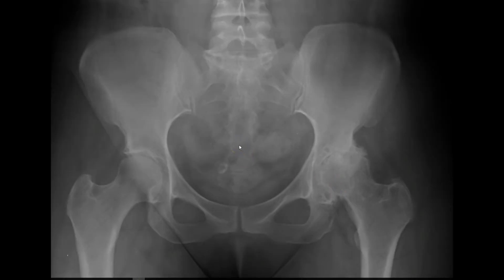So again, just a close up view. She also has a calcified myoma. She's got some fecal material ready to exit. SI joints look like they're holding up pretty well. Symphysis pubis definitely holding up very well. And we were able to get every bit of 5 years out of this hip before she, I remember her asking, when will I know it's the right time for surgery? And I looked at her and I said, when you can't take it anymore. And that was more or less the way it happened.